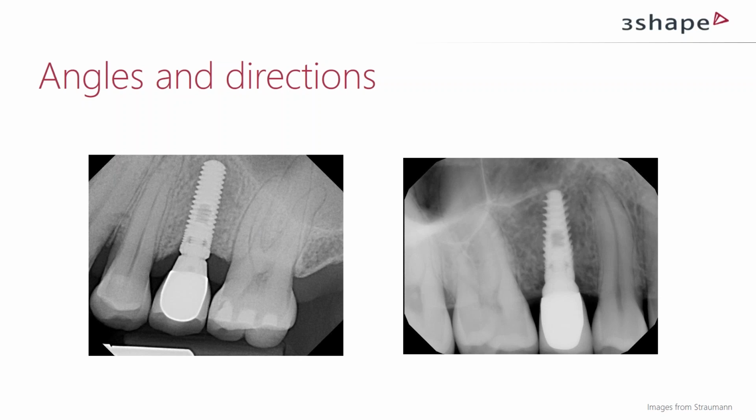So follow nature, yeah, and does that mean follow the direction of the root that used to be there of the tooth and the natural tooth as well? So you kind of combine, you can see what's behind or below tissue level and what's above tissue level, or is it always let one or the other thing steer you?